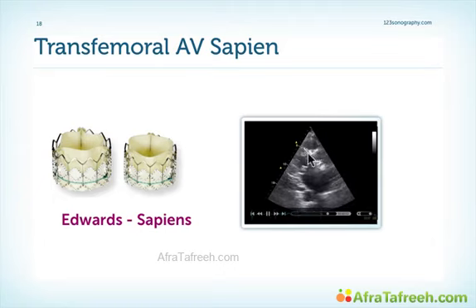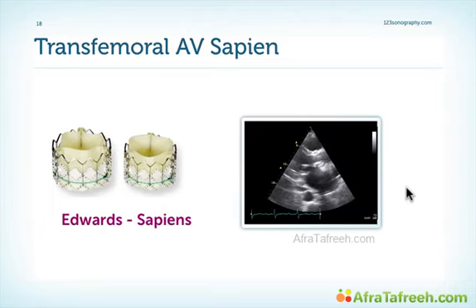We have the stent here in this region. Very often we have fairly echogenic material here on the top and the bottom, which is the residual calcified aortic valve. And in between we have the biological tissue again.